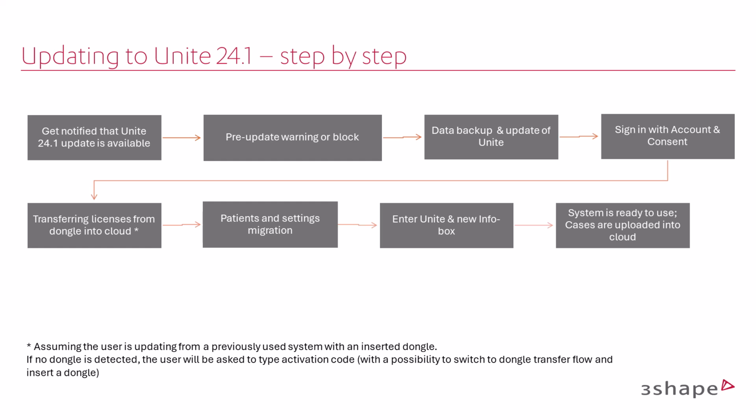Finally, the old cases will be uploaded to the cloud. This is done last because cases are the largest files to upload. They'll be uploaded in the background, allowing you to continue scanning new cases and patients without interruption.